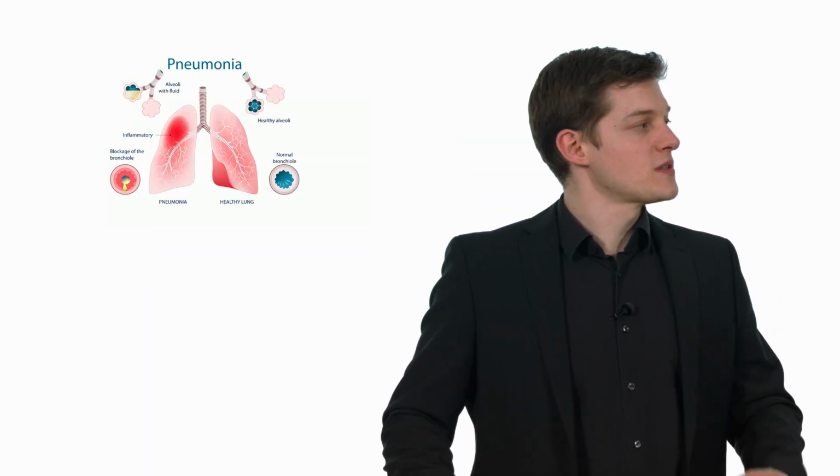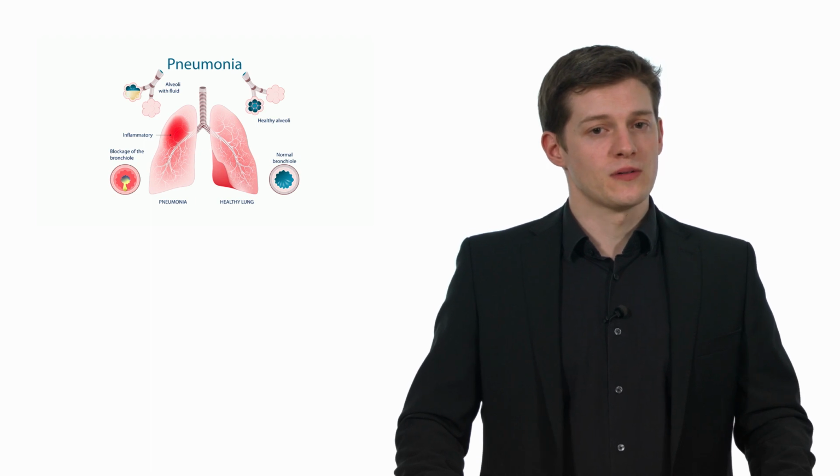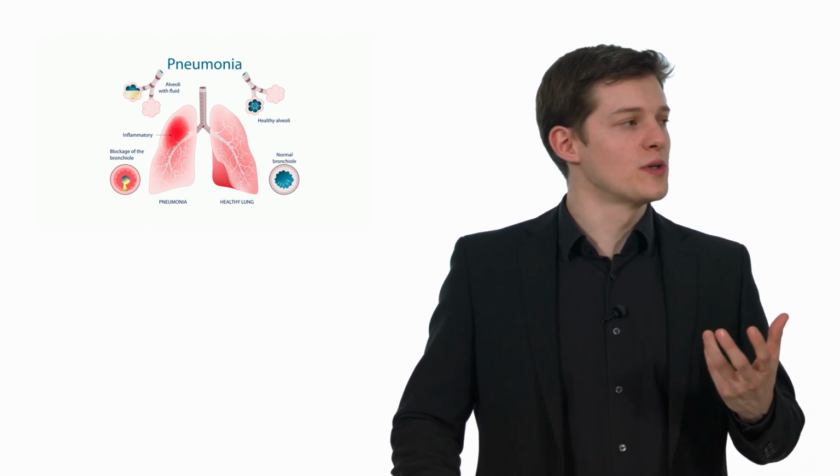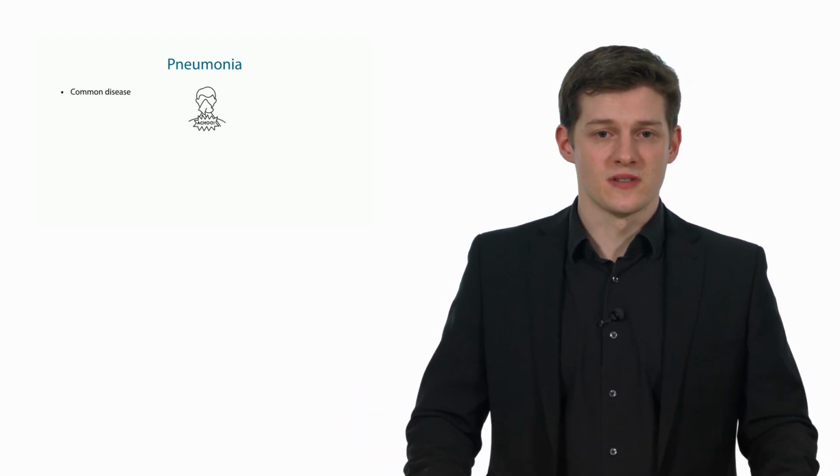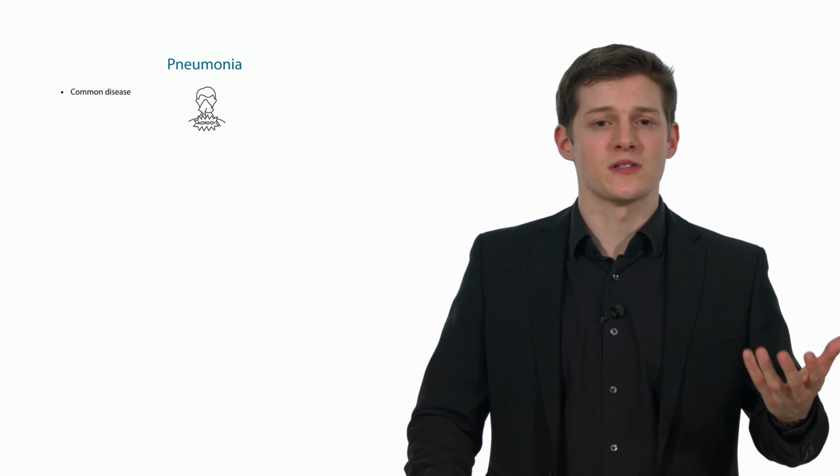How important is a chest X-ray in the diagnosis of pneumonia? Basically, we use chest X-ray in diagnosing pneumonia, but I want to show you how to do it with lung ultrasound. First, pneumonia, of course, is a very common disease. I bet every one of you treated patients with pneumonia.